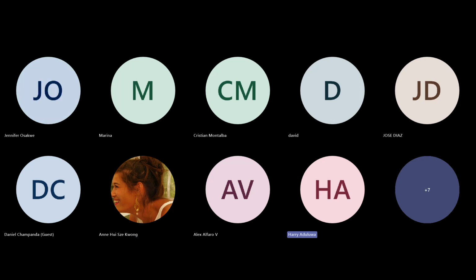Permit me too much question. I know the MRI system has a way of correcting for motion artifacts. Motion correction particularly is used for mapping, yes. So does the software also have some kind of correction for the flow, because sometimes you get some imaging from patients that you just have to manage yourself too.